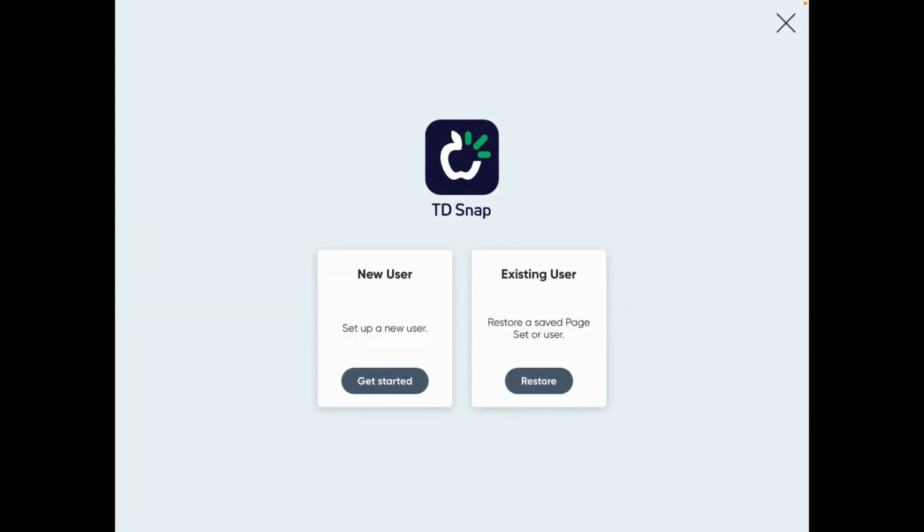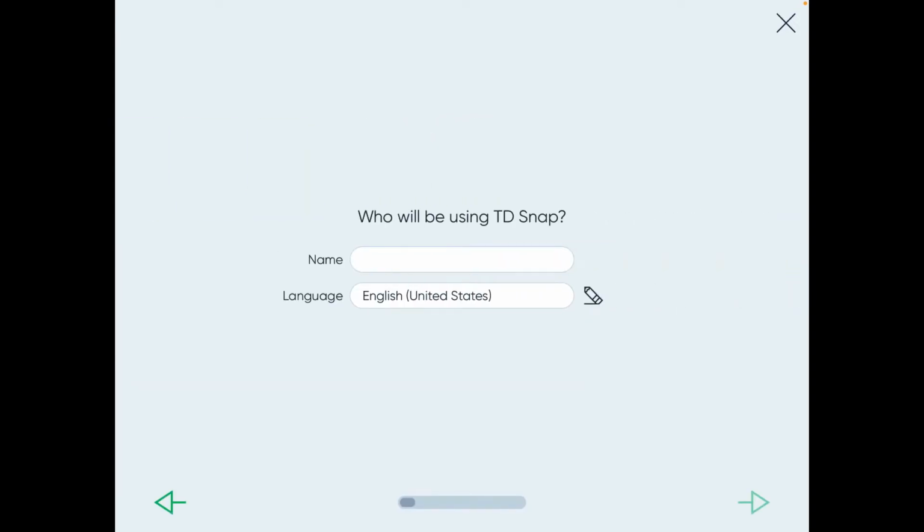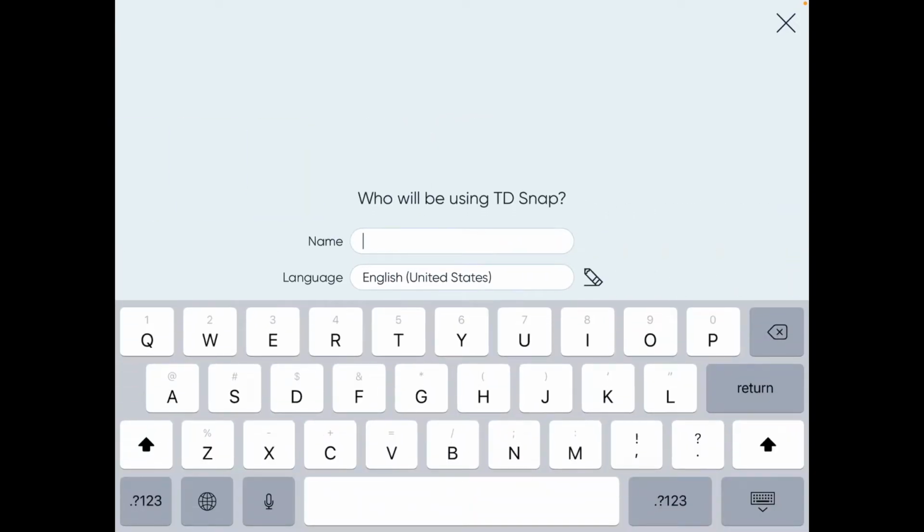Well, it just launched in the UK. Tobii Dynavox has launched Motor Plan 30 and Motor Plan 66 new page sets. And I saw that I had an update waiting for the app here in the USA. So I went ahead and did that. And I'm going to try this out.